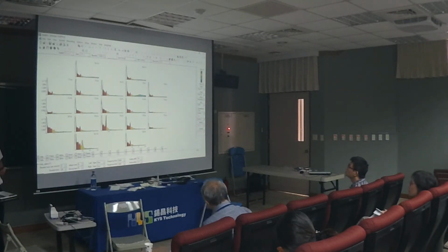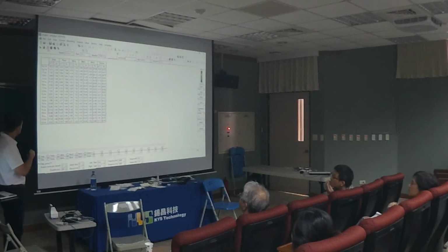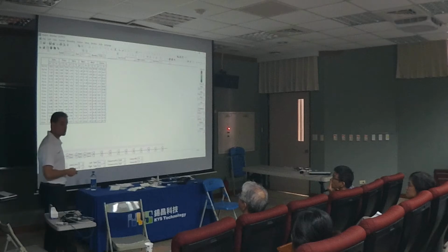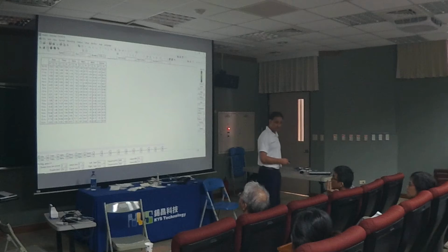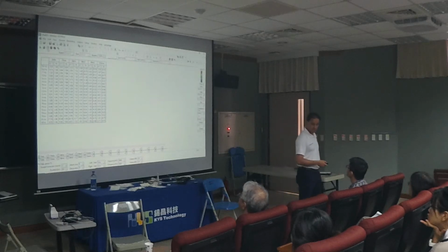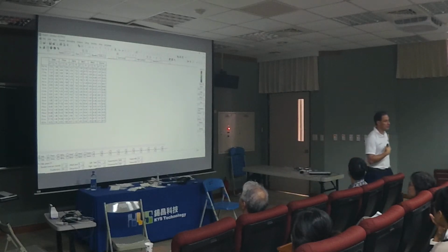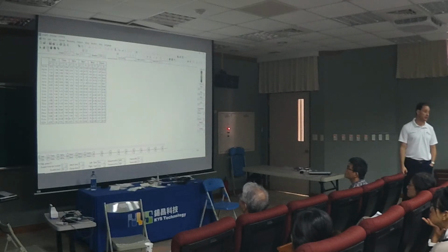So we come to the alpha, which is the highest peak, and we can look at it from the table. So PC, look at his alpha, 7.32. It's very, very low for somebody who's age 10. If this was somebody who's 60 or older, I would start suspecting a dementia case or some kind of neurodegenerative disorder. But for this kid, look at that. I mean, ADHD, 7.32, so his IQ is suffering.